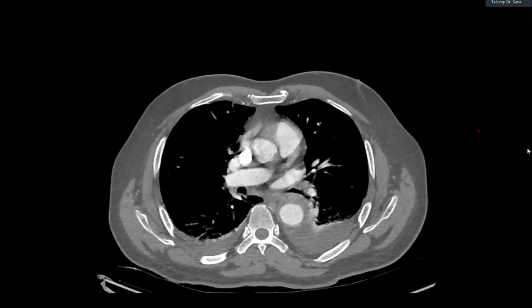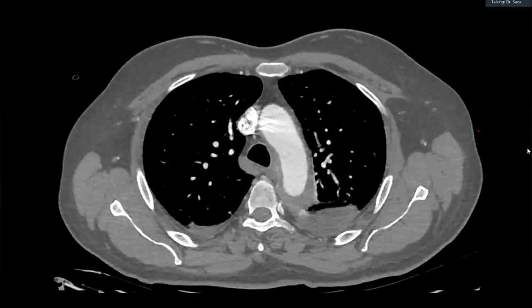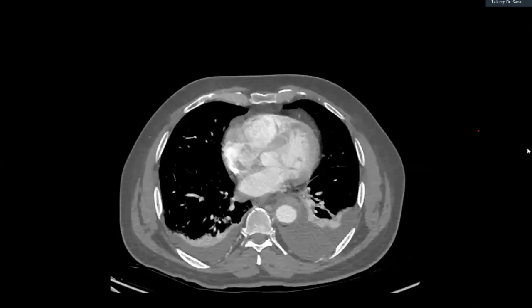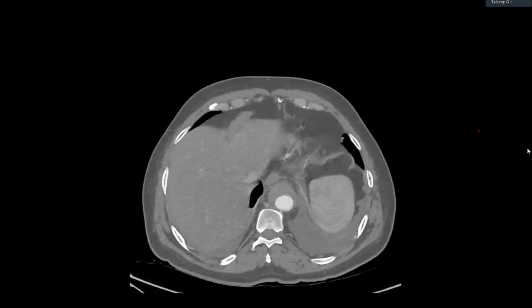There is a bilateral pleural effusion, and there is also a hypodense area surrounding the descending thoracic aorta, up to the visualized slices of the descending abdominal aorta, with bilateral atelectatic lungs also noted. Ignore the lungs. Don't worry about the lungs, but you're doing very well.